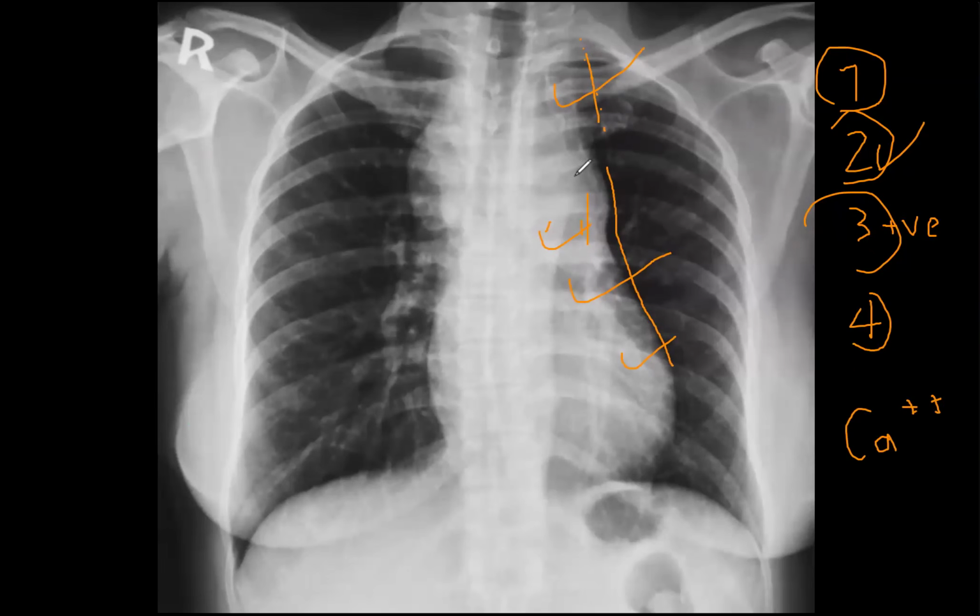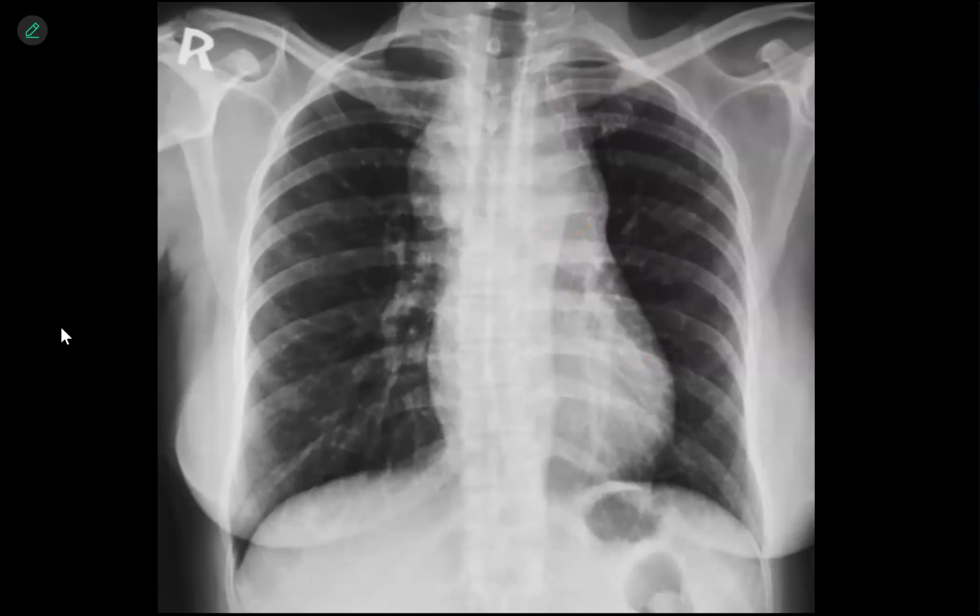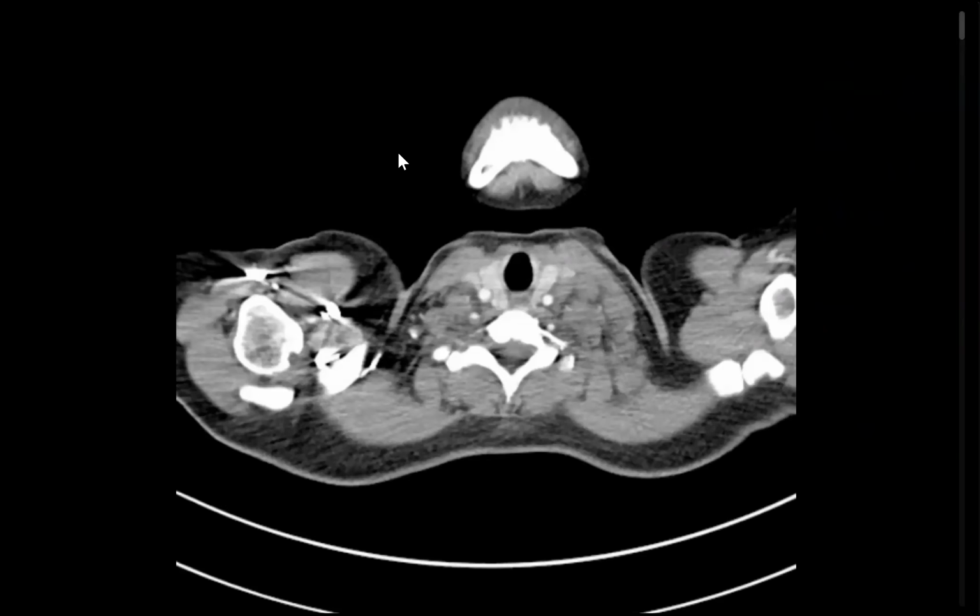No differential densities, no intralesional calcifications. The differential diagnosis includes, sir, for anterior mediastinal: lymphoma, thymoma, lymphadenopathy, thymic lesion, and germ cell tumor. Less likely germ cell tumor or teratoma due to age group. Very good. And unlikely thyroid. Good. And now from the CT scan, you can scroll.